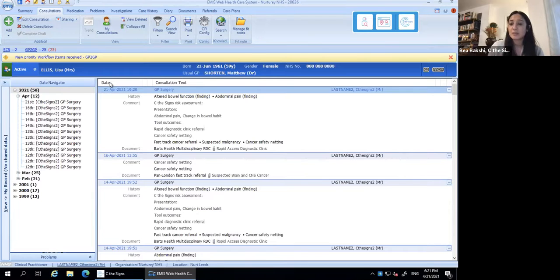Okay, let me just go down that pathway because it's made my decision slightly easier. Or similarly, you might see that this patient doesn't qualify for a cancer referral pathway, which helps validate the kind of conversation you have with the patient to say, you're not at risk. There is nothing to suggest you're at risk, so I'm going to do a routine referral. So you can also consider using it both ways with patients to help reassure them, even when you're not suspecting cancer, but you just want to double check to reassure the patient as well.